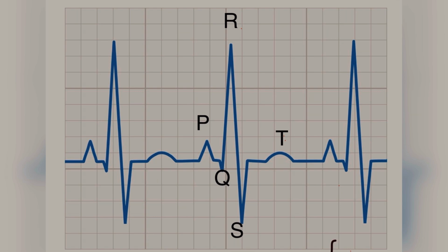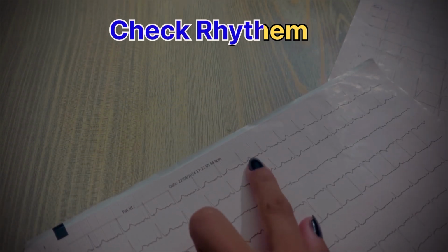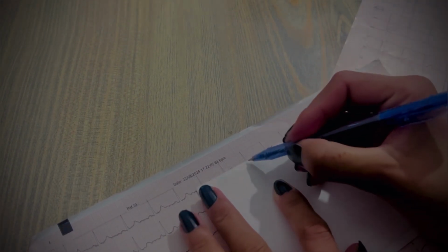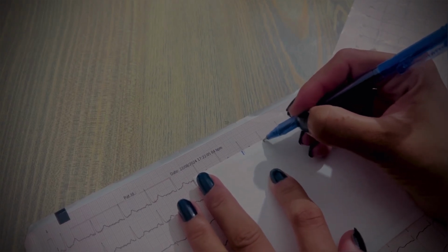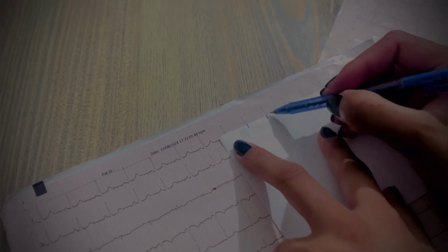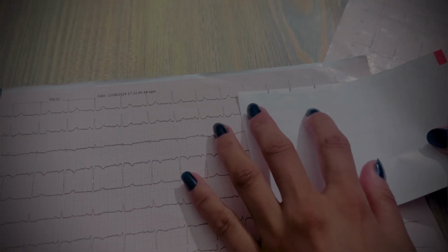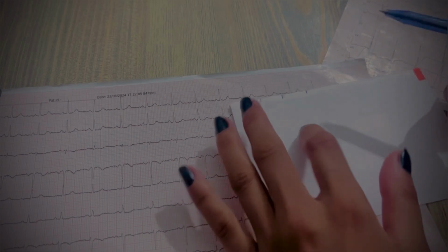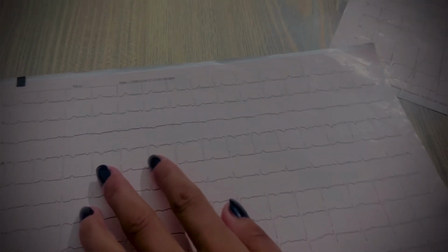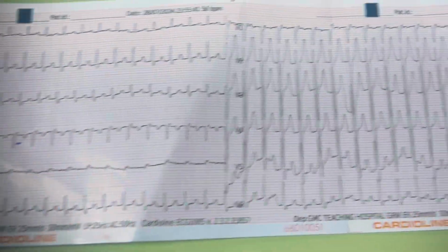Now we'll start by checking the rhythm to see if it is regular or irregular. To do this, place a clean paper along the ECG strip. Now mark the peaks of a few consecutive QRS complexes on the paper. Then move the paper along the strip to compare the marks with the QRS complexes. If the marks line up perfectly, the rhythm is regular. If the marks don't match up exactly, and the peaks fall a bit before or after the marks, the rhythm is irregular.